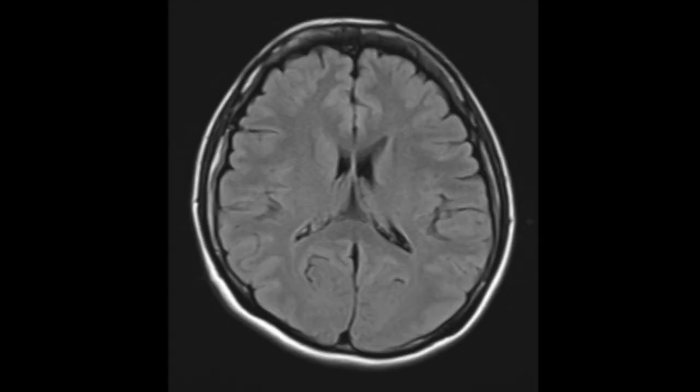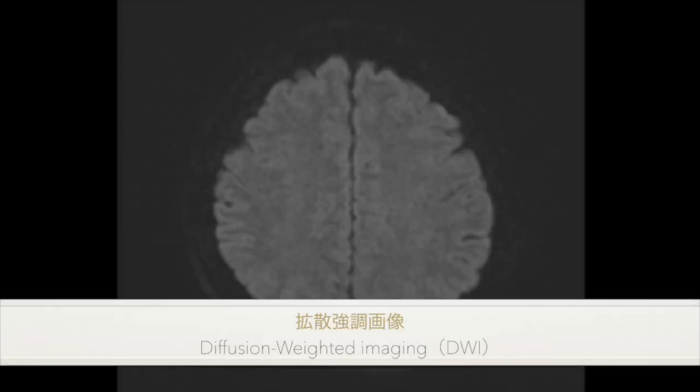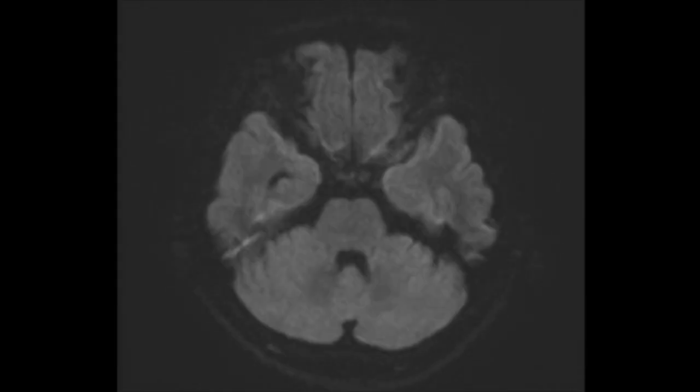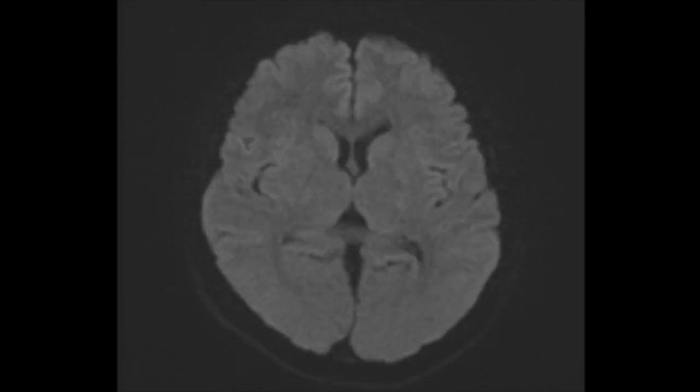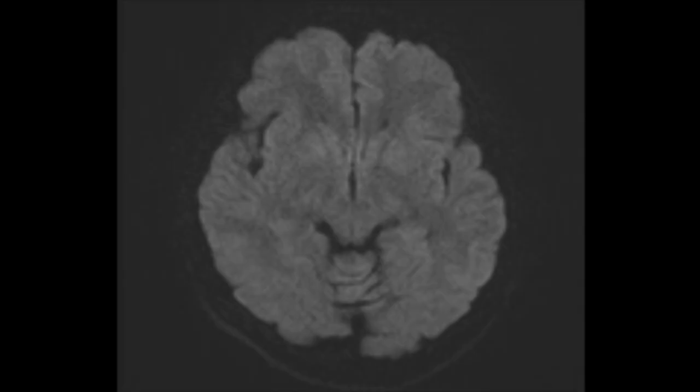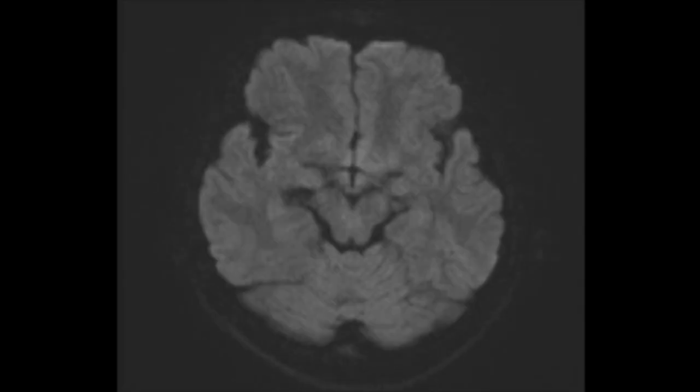Next, let's look at this image. Diffusion-weighted imaging. To skip the technical details, this sequence tends to show regions where neurons have been damaged, such as from stroke or brain tumors, as bright areas. A quick glance here shows no obvious abnormality. There isn't any apparent acute lesion destroying brain cells.